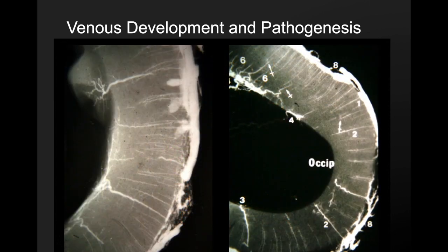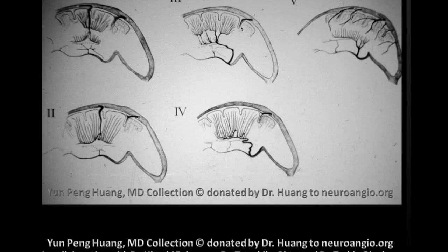And here's just another example of that. So essentially, here's an example, right? Example 3. There's no superficial cortical vein right here. So instead, all these veins that are in this gyrus are going and converging into larger collectors, and then into this big tributary. And various examples of that: here, loss of maybe a deep venous collector, so everything drains here and then into the superficial system.